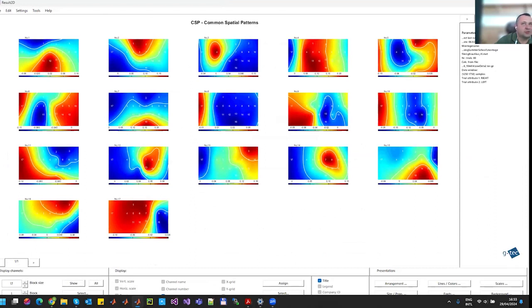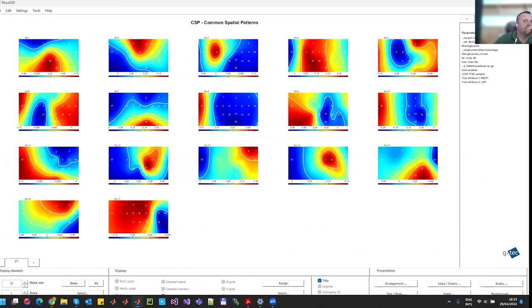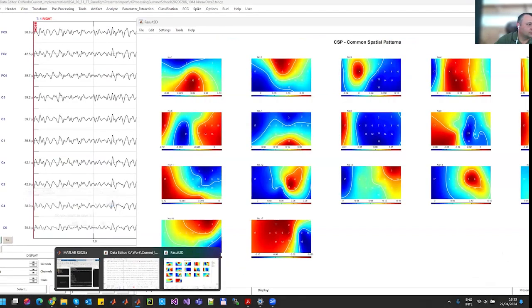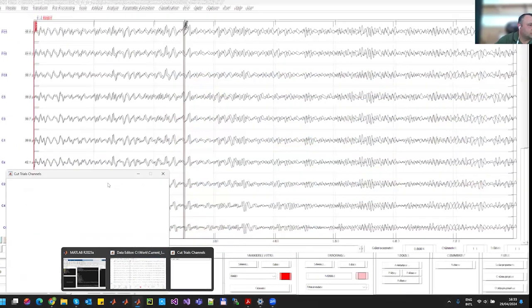Again, I forgot to exclude the last channel. I will do it very fast again. Channels and the last channel.